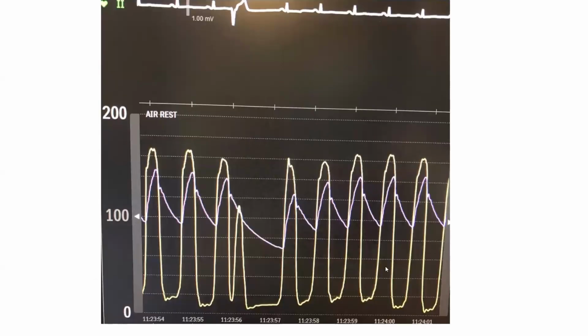This is another case. What's the diagnosis here? AS. Why? I like people to elaborate. That helps you practice in your brain. This is aortic stenosis. One, the LV and aortic pressure are not hugging each other in systole. Two, there is no spike and dome morphology of the aortic pressure. In fact, there is a small anacrotic notch that you may see here. There is no late peaking of the LV pressure, no narrow late peaking. So this is consistent with aortic stenosis.